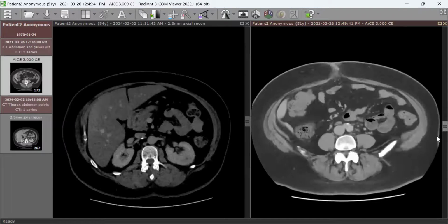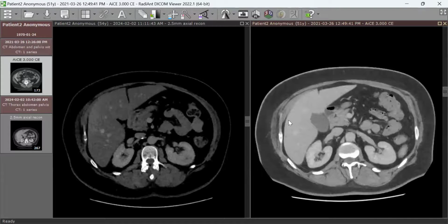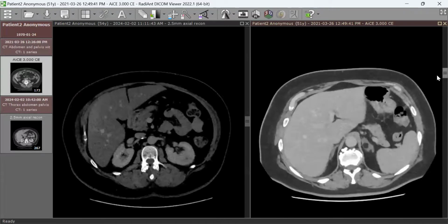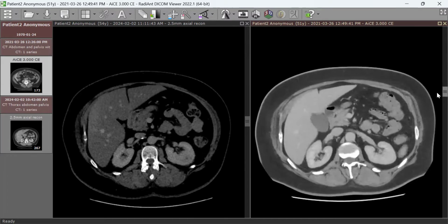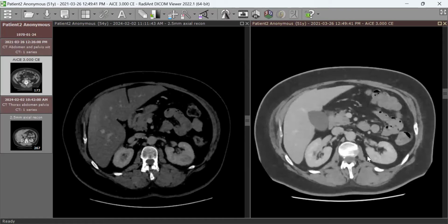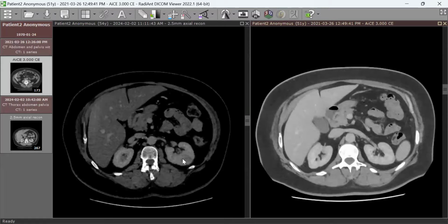So this previous study obviously is here because there is no hernia here. If you compare the liver before, it has changed in appearance, but there was no obvious steatosis. Myelolipoma is there and everything, but in the kidney there is a well-defined mildly enhanced area. This lesion wasn't quite obvious, it was probably there at least grossly. So this is the focal lesion in the left kidney now.